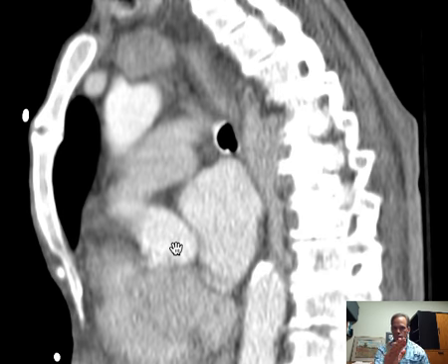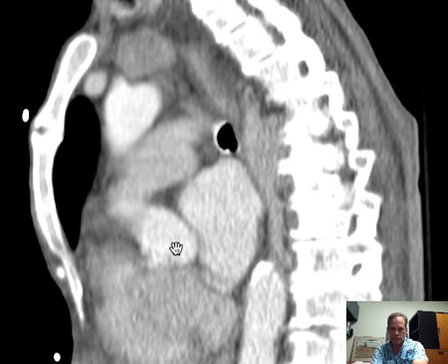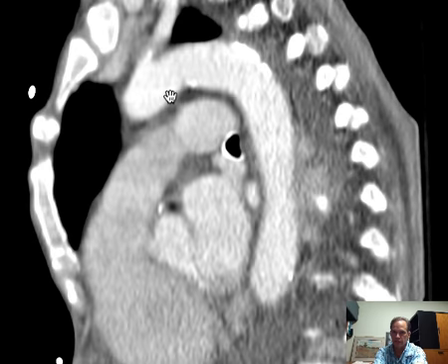But because of that little twist that is undergone during embryology, they change positions, and the pulmonary artery ends up inferior to the aortic arch. Remember, it divides inferior to, below the aortic arch. Well, we can very clearly say that this is aortic arch.